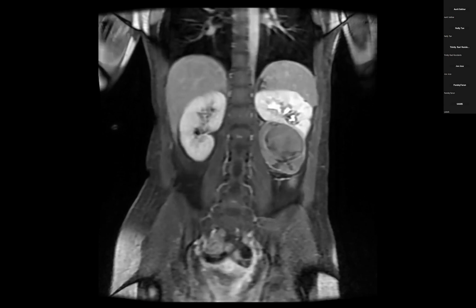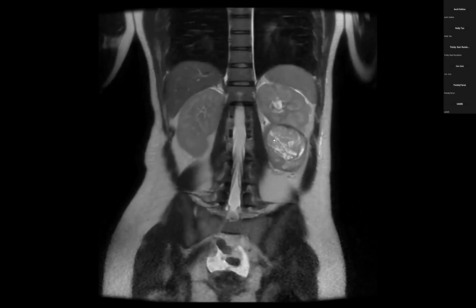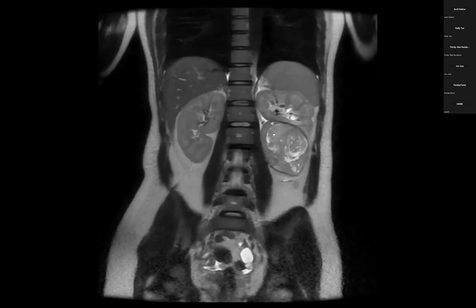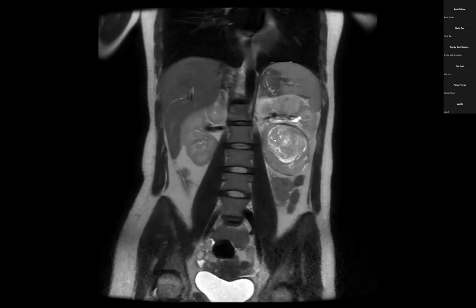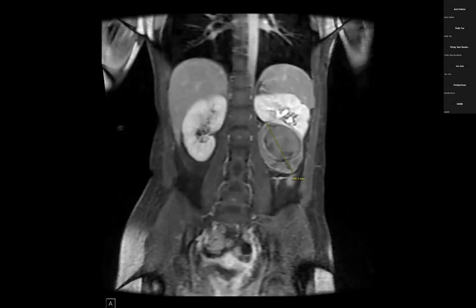What about like a mesoblastic nephroma? But it's not very cystic, it looks solid, no? Yeah, this is solid. Okay, Melina, save us anyways. Tarun, save us. Sorry, not to know.